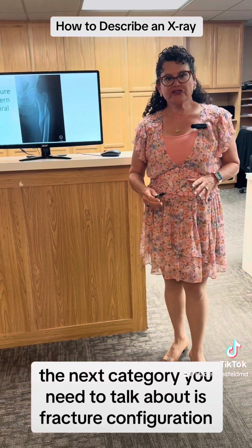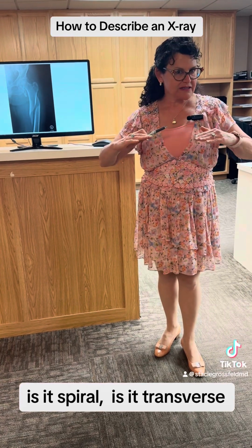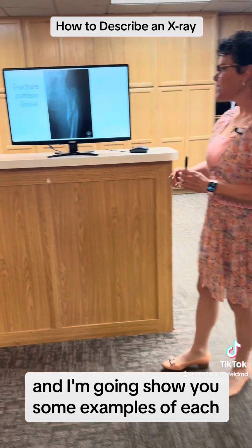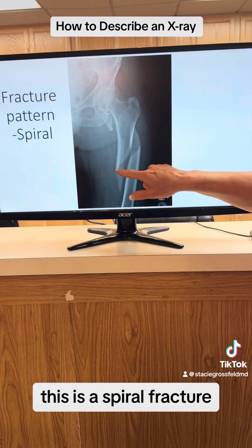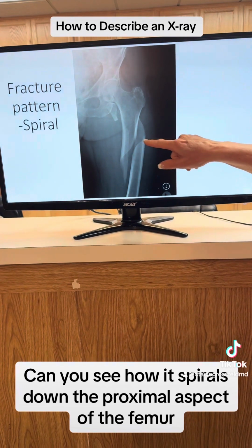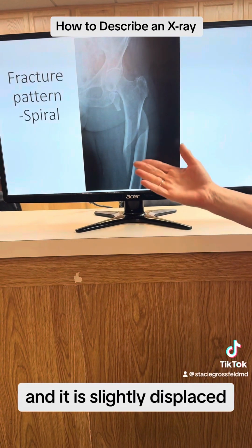The next category you need to talk about is fracture configuration. Is it spiral? Is it transverse? Is it oblique? And I'm going to show you some examples of each. So this would be fracture pattern. This is a proximal femur. This is a spiral fracture. Can you see how it spirals down the proximal aspect of the femur? And it is slightly displaced, non-angulated.